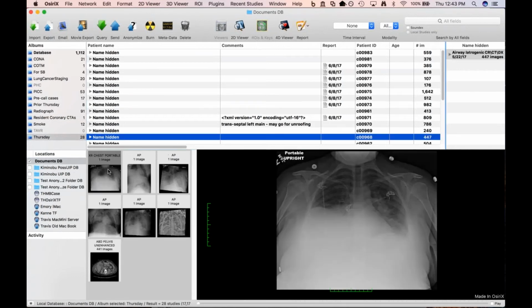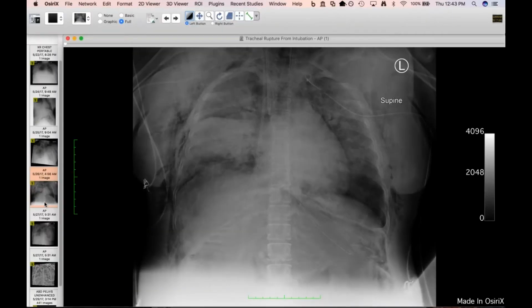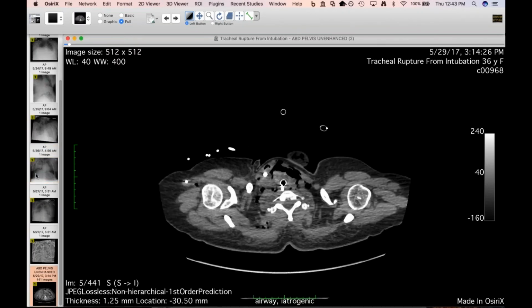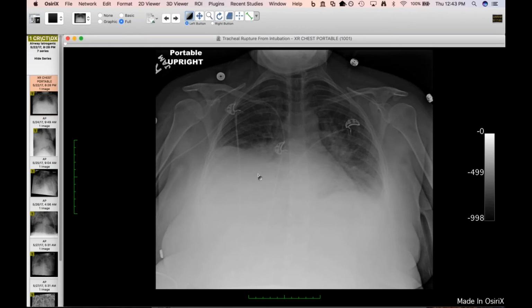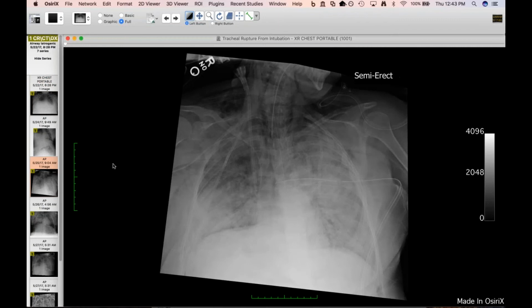Start with this one. This is more iatrogenic. Oh man, let me make sure this is the right one. I think it is. Yeah, I guess I don't have the original CT. This lady had an outside CT. She was kind of a disaster, as you can see here. But anyway, she's pregnant at an outside hospital, ended up with like a bedside C-section or something that just sounded kind of disastrous. And to make a long story short, ended up intubated a couple of days after this study. This was on the 22nd.